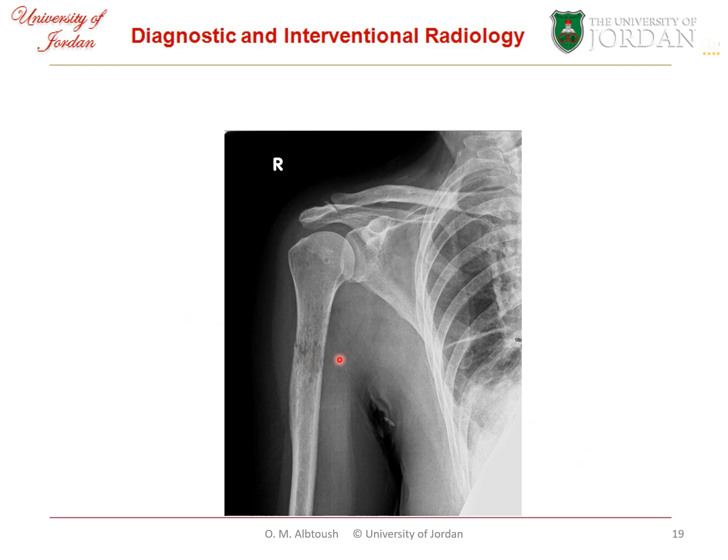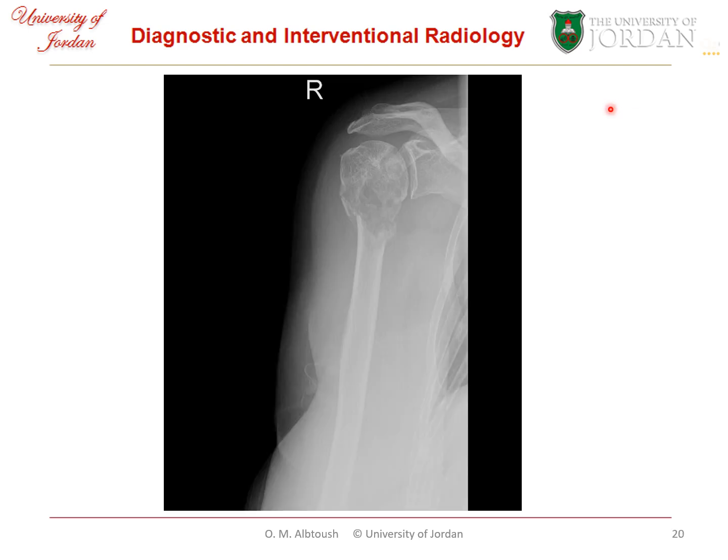So this is indicative of pathological fracture. If you suspect such an appearance and you are not sure, simply advise an MRI scan to be done.